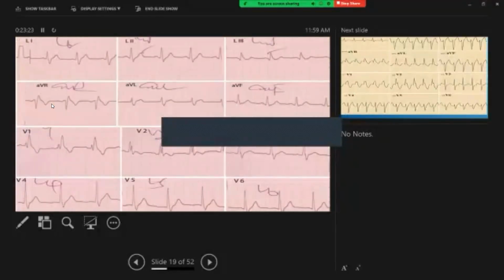Now this ECG, there is no tachycardia, but I selected this ECG to discuss about another cause of broad complexes. Now again, in sinus rhythm, broad complexes are there. In AVR, P wave is inverted, and this is biphasic. And if you analyze lead V1, you can see 2 R waves, and there is a S wave in between. The amplitude of the first R is less than the amplitude of the second R. So this morphology of QRS complex is called rabbit's ear morphology.